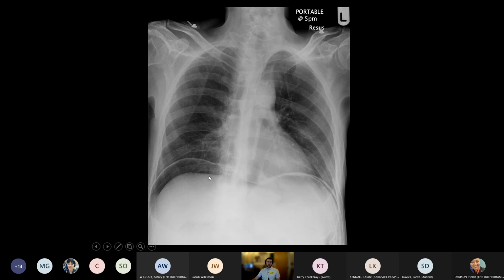With pneumoperitoneum, you've got a clear interface between where the air is sat on top of the liver. So you have this classic dome appearance of the liver and this nice, well-defined crescent of air here. There is a little bit here on this left side, but you've got to be wary that there is stomach gas normally under this left hemidiaphragm.